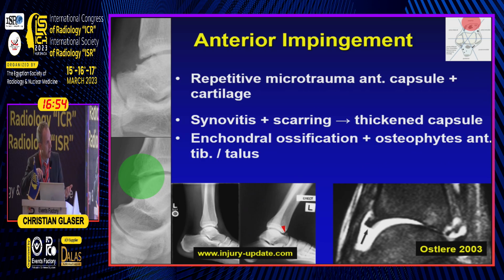So our target area would be the anterior aspect of the tibio-talar joint, and in X-ray we could appreciate subtle osteophytes on both sides of that joint, which become understandable as a potential component in the impingement process when you look at these so-called functional studies, when you do see that there may be impingement.